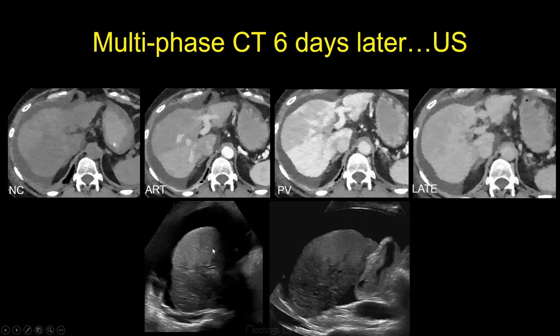And we knew based on previous imaging that we had thought that the echogenic areas represented islands of normal liver or regenerating liver. And then the posterior right lobe of the liver was more shrunken and atrophic, kind of had collapsed and was enhancing more than the anterior part of the right lobe. And you can see here's the anterior, this part that's enhancing more, but on ultrasound, it was hypoechoic and had shown signs of atrophy. So we were really puzzled. Also note this patient now has ascites and pleural effusion.